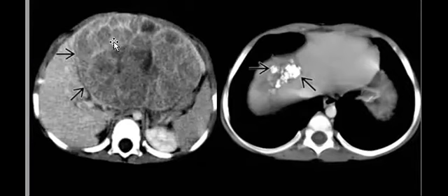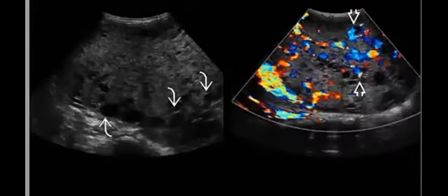And let's go to the liver, and the third one in the pediatric age group. If you find an ultrasound like this, and you are lucky, you can mention it. So how do you describe it if you find the ultrasound like this?